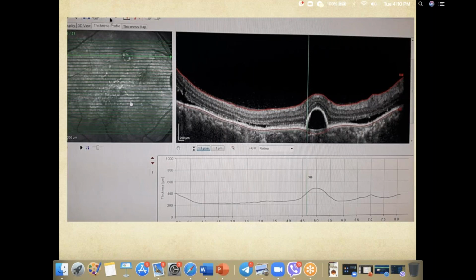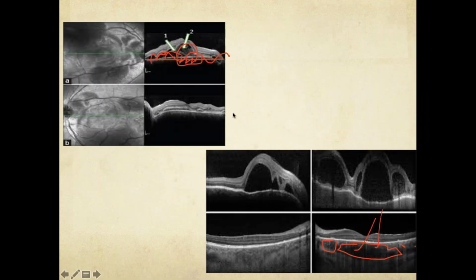A 57-year-old female comes to you with the same history, tinnitus, all of these things. So as I mentioned here, no uveitis features, choroid is near normal, lots of PEDs, lots of CSCRs, no uveitis, hypertensive patient.